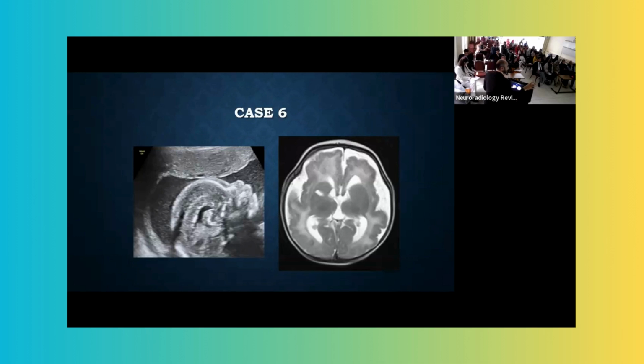Although I deliberately did not show you a lot of calcifications, you would have got the diagnosis correctly, but this makes you think, if you just have the MRI scan, how would you approach it? So there are lots of features. We have brain atrophy, okay? We have some hydrocephalus, we have polymicrogyria, and extensive white matter lesions, leukoencephalopathy.